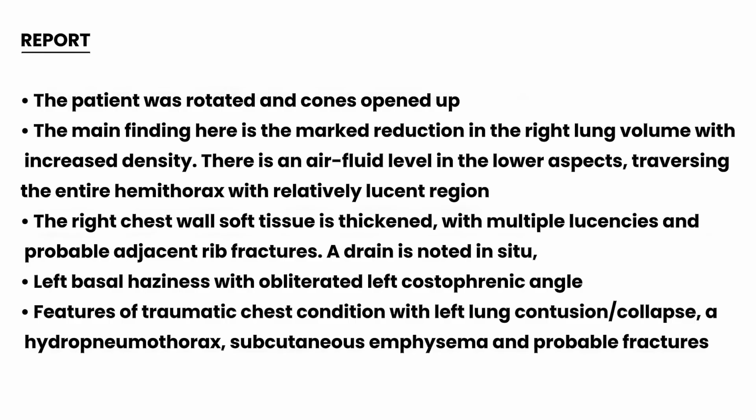Again, these are features of a traumatic chest condition with left lung contusion, collapse, a hydropneumothorax, and subcutaneous emphysema, probably with fractures.